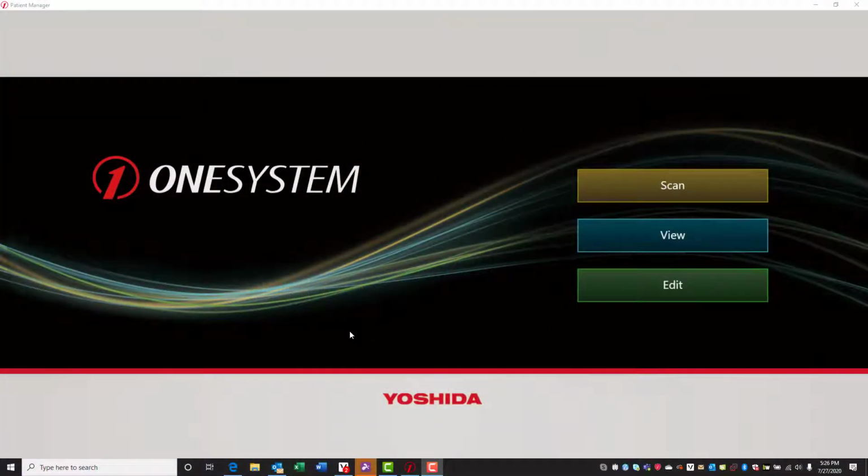The 3D software that comes with the unit has been crafted to not only be powerful, but also to be easy to use. Whether you're bringing up an existing patient or scanning a new patient, it's incredibly intuitive. As you can see here, as you enter the software, it's very straightforward. In this case, most of the time, you're either bringing up an existing patient or scanning a patient.